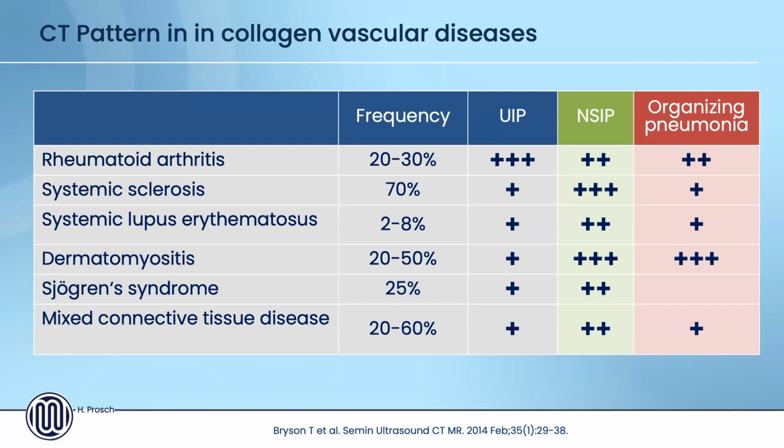Moving on here, I should explain reticular abnormalities. I will do that in a second. UIP and NSIP have a basal and subpleural distribution, so the difference lies in ground glass versus honeycombing. That's correct. So if you see just ground glass in a basal and peripheral predominance in the context of a connective tissue disease, again, the context is important, you are safe to call this NSIP. If you see honeycombing in the basal and subpleural predominance and no signs of another disease, then you call this the UIP pattern.